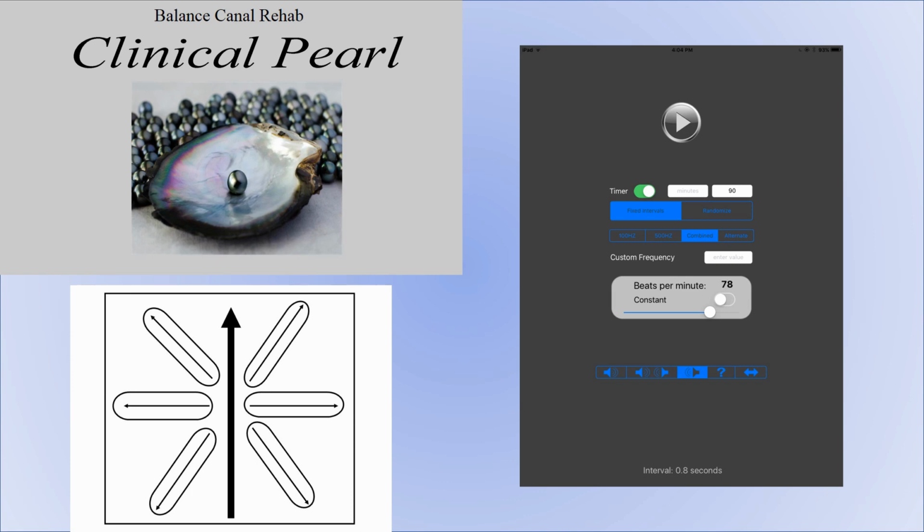So let's say in a patient we've discovered through clinical examination that their right posterior canal and left anterior canal pair is deficient or dysfunctioning. Our setup would be such that we set up the combined mode, 90-second intervals, fixed interval. The combined mode, remember, is going to put tone 2, which happens to be the 500 hertz tone, in the ear we select. Now, given our example here, we said the posterior canal on the right side is dysfunctional.